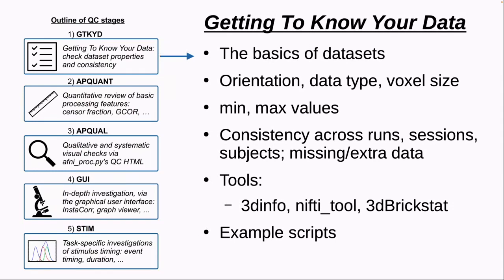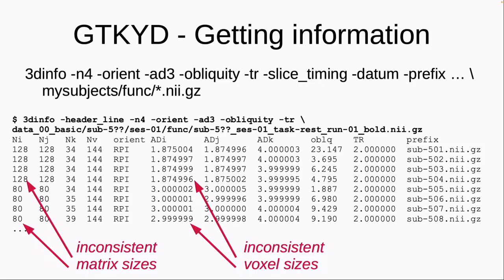We have these tools, 3dinfo, nifti_tool, and 3dBrickStat, to help us get this information. We also provide example scripts, like with our Frontiers project, to take a look at these kinds of facts from our data. So let's see what kind of facts we can get out of this.